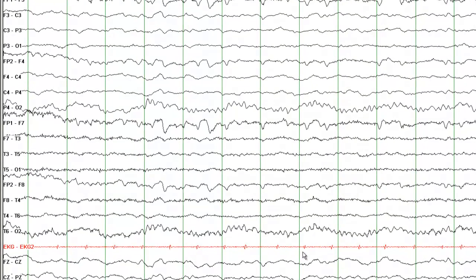Started with a very interesting EEG. I'll provide you with a brief clinical history, and as we go along, I want you to compare the two sides, so compare the two hemispheres. Try to identify asymmetries in this EEG, identify the state of the patient, whether this person is awake or asleep, and then try to recognize abnormalities that may correlate with the clinical history.